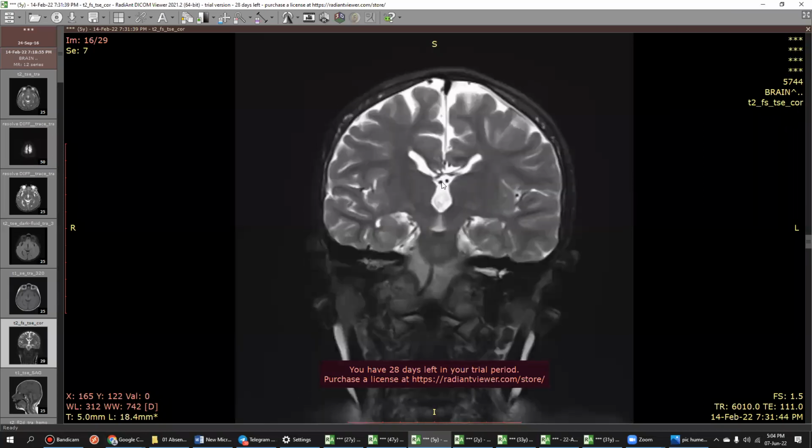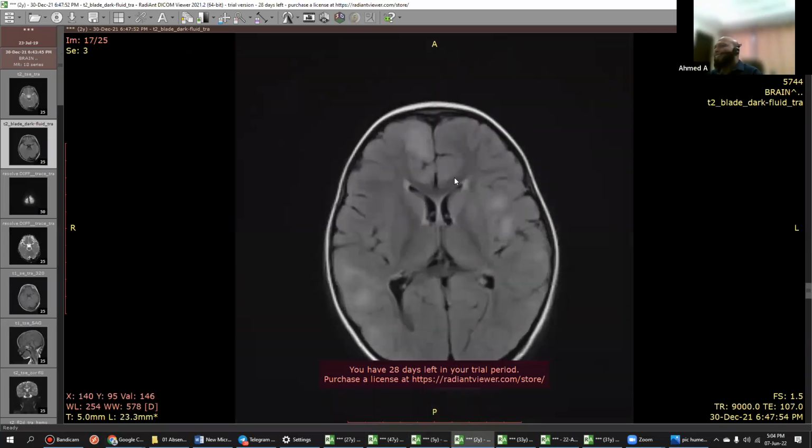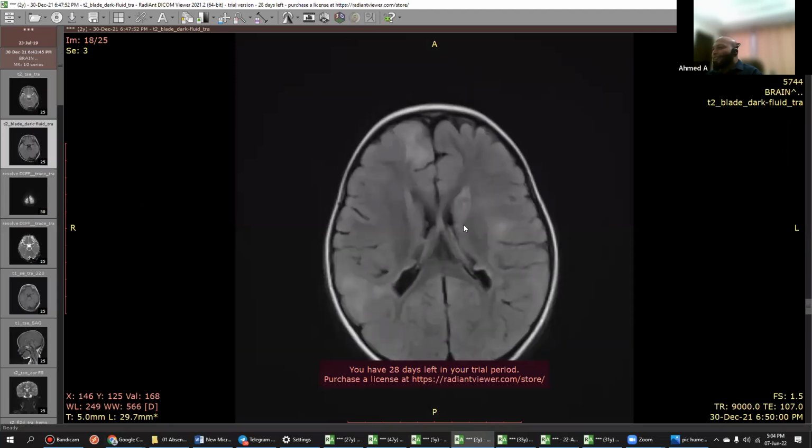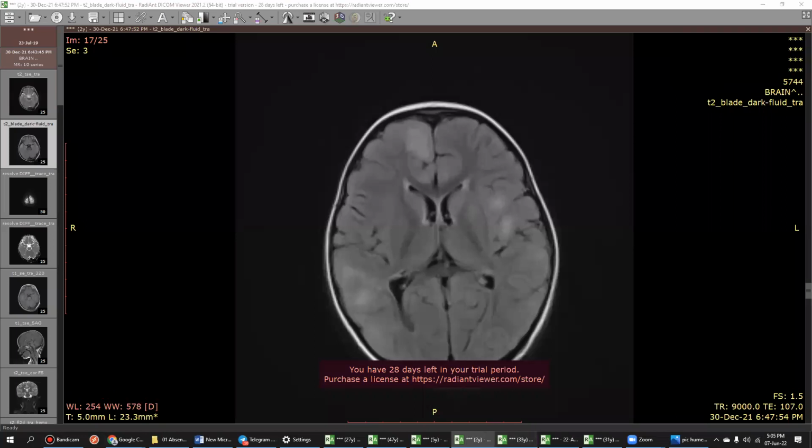So these are two eyes, smiling at me. And one more case, I think this one. And this was spot on. You knew it. When you saw it, you knew it. So you tell it as early as possible. Don't wait for it. Ideally you have to say, I'll confirm this on T2 flare. On T2, it looks to me like tuberous sclerosis. That time, the examiner moves on to the next case instead of wasting time here. So you get more marks.